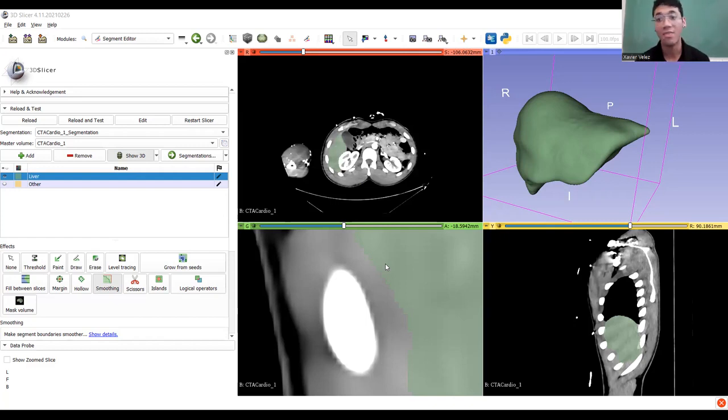Okay, so from here, now we're going to go into how to get this ready for 3D printing. This won't be a comprehensive guide, but just in terms of using our 3D printer, what you'd need to actually load into the 3D printer. Because unfortunately, 3D printers don't really know what to do with just an STL, like an object file. They don't really know how to read that, at least not the ones that I've worked with. So we're going to want to convert.